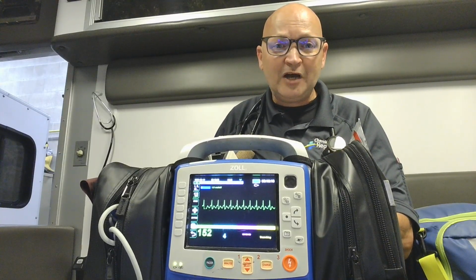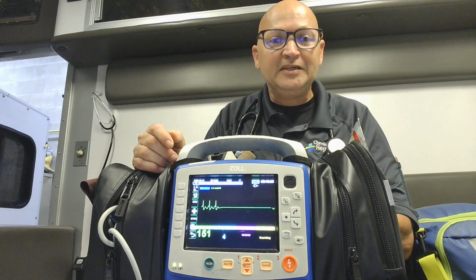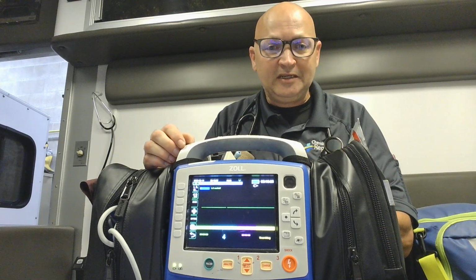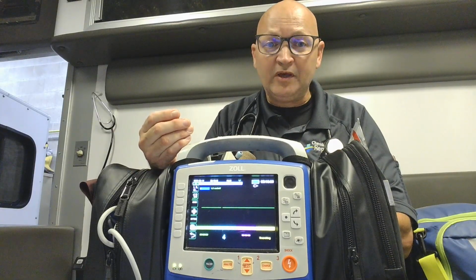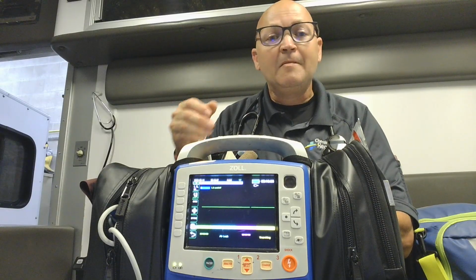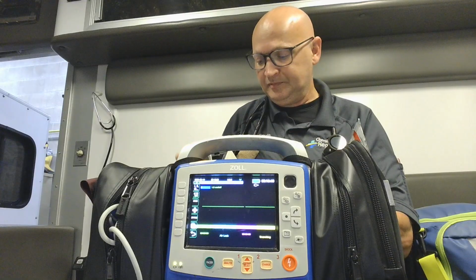Hopefully, if you do a good job in the medical field, we prevent this patient from being in this rhythm. This is known as asystole, which means the cessation of all electrical activity in the heart. With asystole, we try to treat it and get the patient into a shockable rhythm. We give medications such as epinephrine and perform CPR during this. But asystole is also one of the ways that we confirm death.